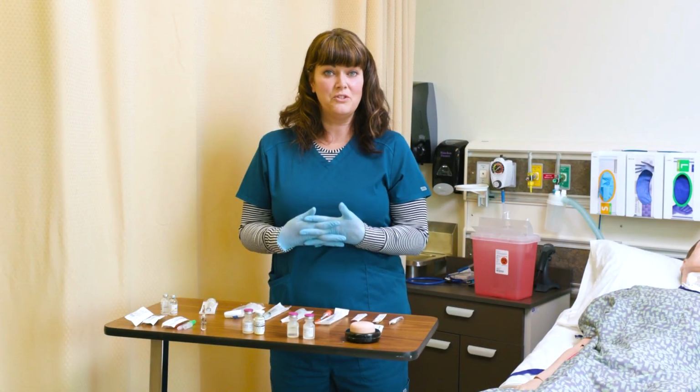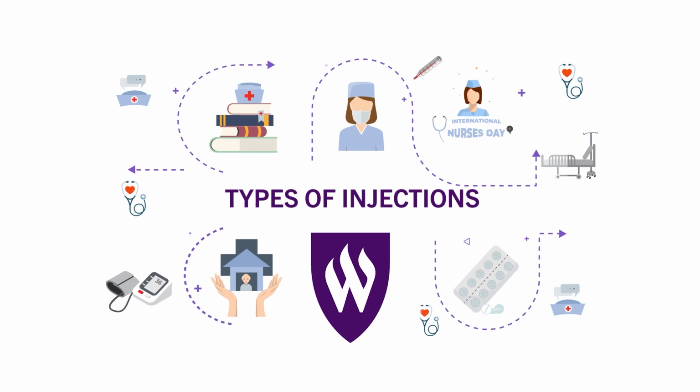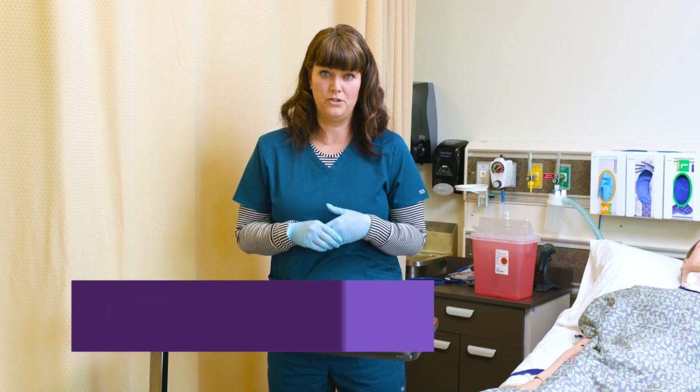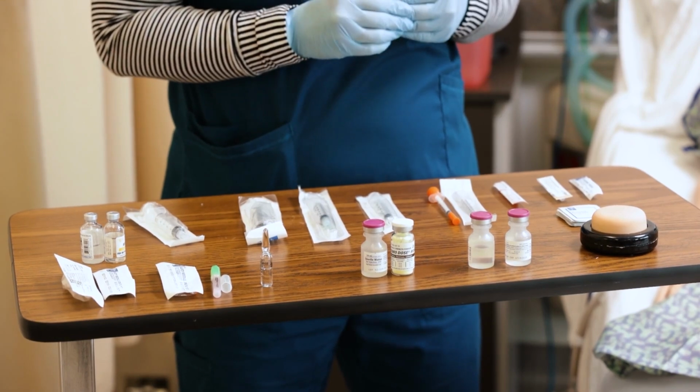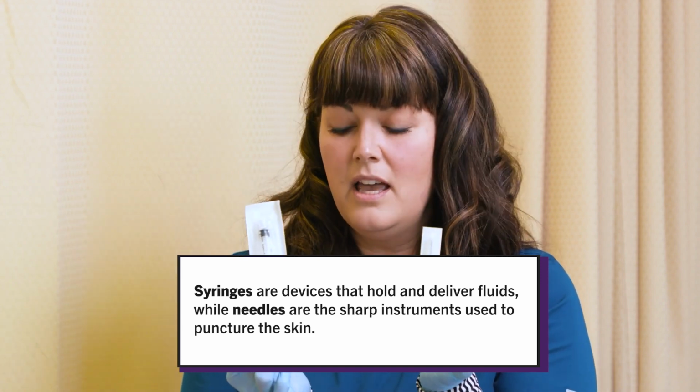Okay, so we are going to teach you about needles. Part of your skill of giving an IM injection is determining what size needle you will need and what size syringe, depending on how much quantity of medication. So we're going to talk about first the size of syringes. Remember, a syringe is different than a needle.